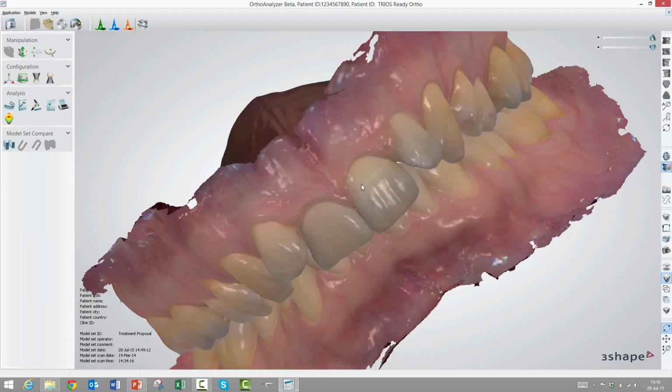There are ways that you can configure how the right button works, and I'll get to the first couple of tools here in the visualization toolbar. As you can see, at the very lower end here, I have 3 ways to operate the right side of the mouse. The first is what we call rotate view. The second is what we call pan view, and the third is what we call zoom view. Rotate view is default. That's what I've just been demonstrating.